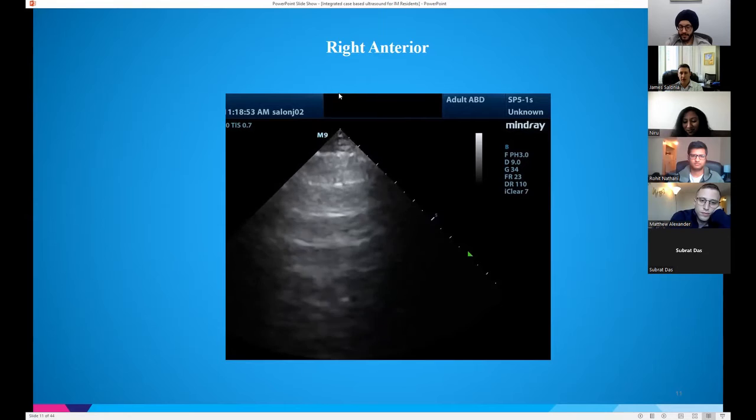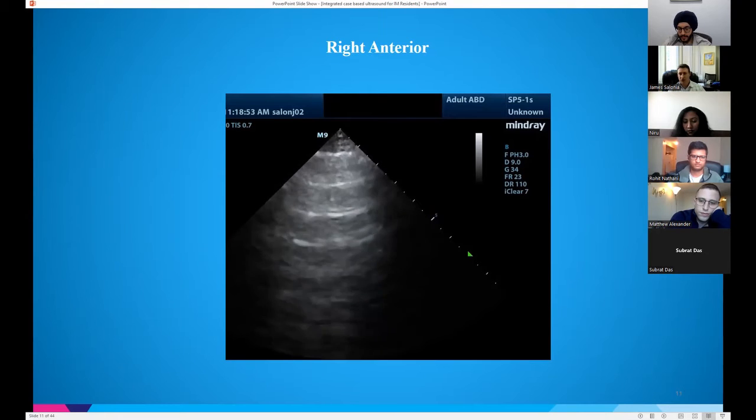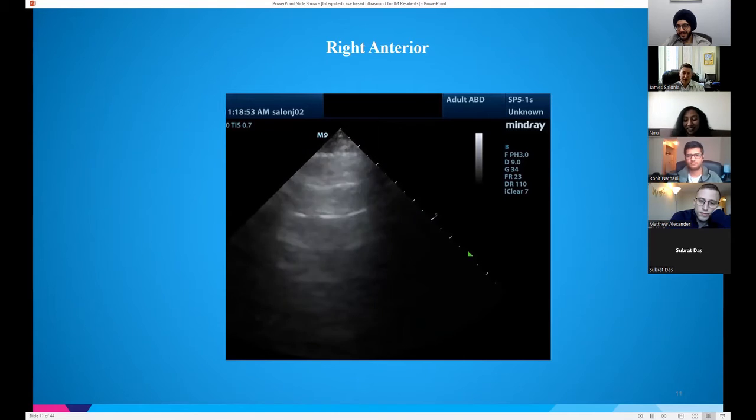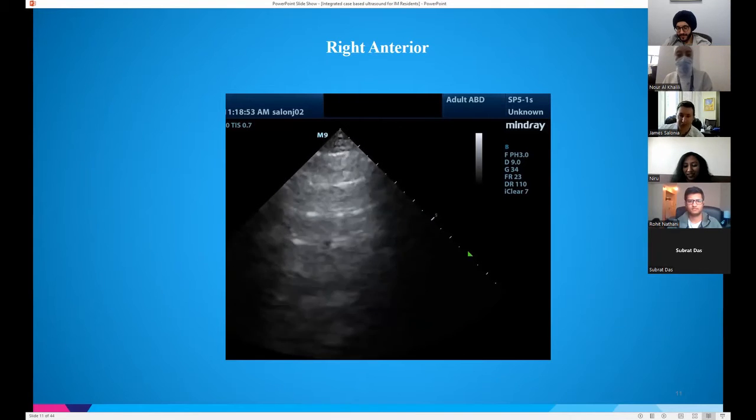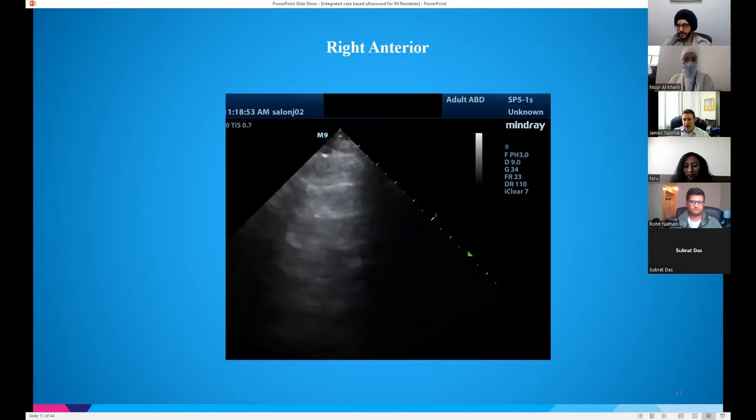The ultrasound is up here. The beams are hitting the pleura. They're bouncing back and forth, being reflected in air. So that's always good, right? You see this, you say, hey, the guy's good. I'm waiting for an answer. Mostly, yes. Okay, so air and lung is good, right? I think we all would agree on that. Most of us, hopefully. Can air and lung be bad?